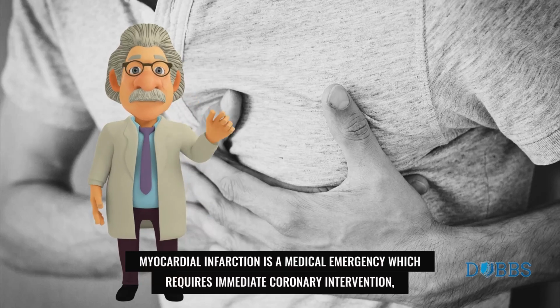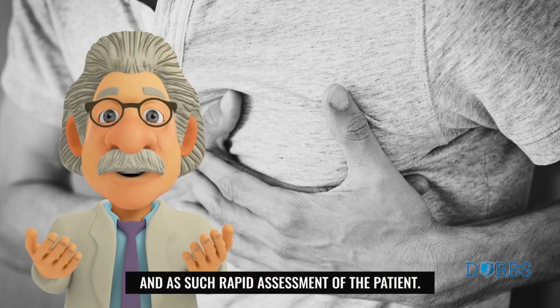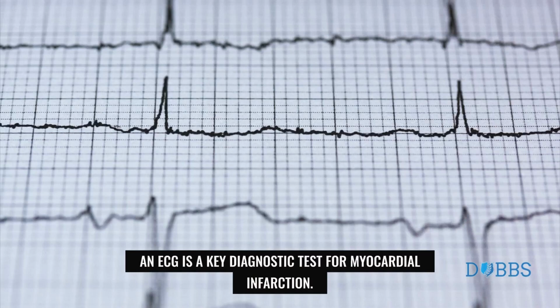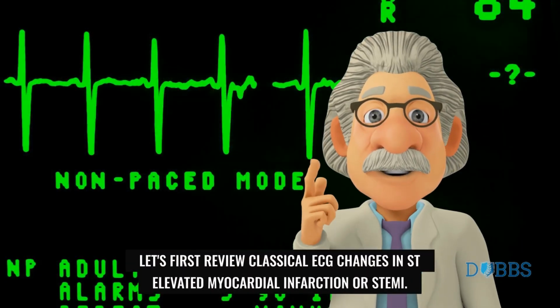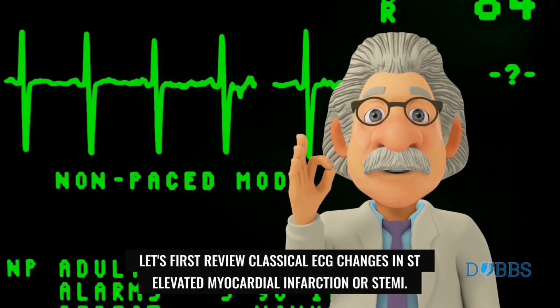Myocardial infarction is a medical emergency which requires immediate coronary intervention, and as such rapid assessment of the patient. An ECG is a key diagnostic test for myocardial infarction. Let's first review classical ECG changes in ST elevated myocardial infarction or STEMI.